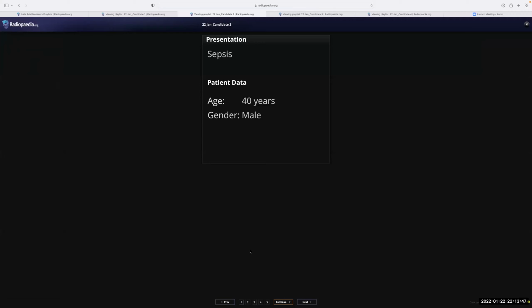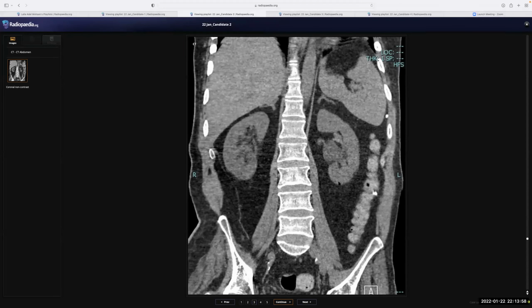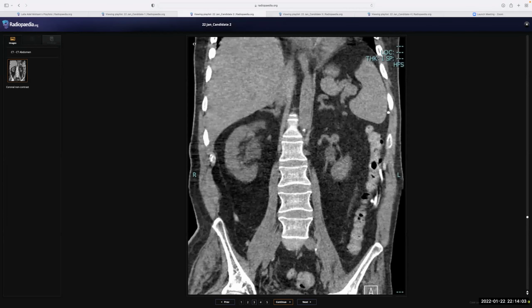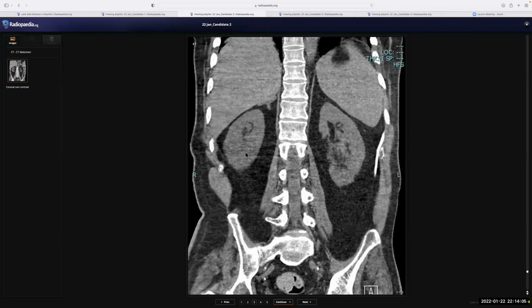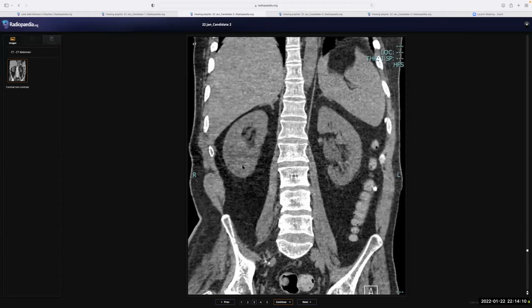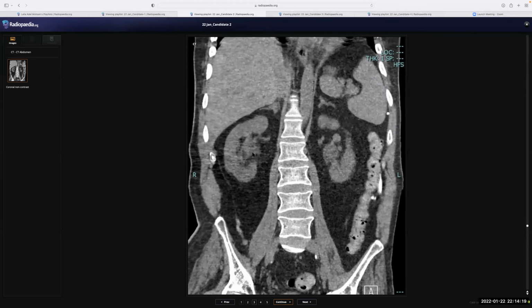And in any case of intestinal obstruction, we have to look for the cause and look for the complications, urgently picking up the phone, calling the surgeons, and also for the viability of the bowel loops. Here, because this is an unenhanced scan, it's difficult to comment on the kidney. Second thing, you can always ask the examiner if you can check for the other views, although it's not available, but I think an X-ray would have been helpful in this case.